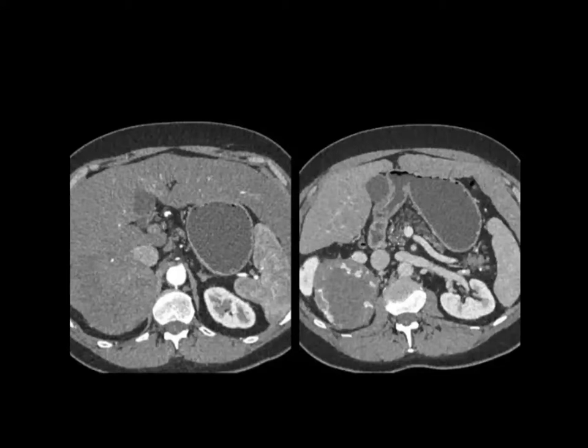What about the fourth one, adrenal cortical adenoma? You would say, well, those are typically under 4 cm. They're not vascular. Well, this was a bit unusual. This was over 8 or 9 cm, and it had vascularity. I thought probably this was going to be a primary adrenal carcinoma. Second choice was a vascular pheo.